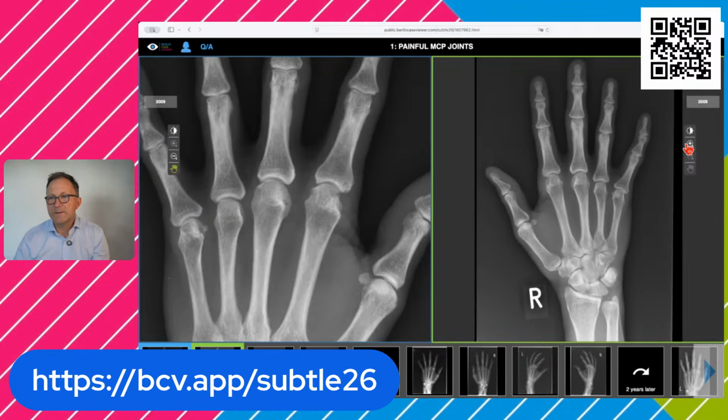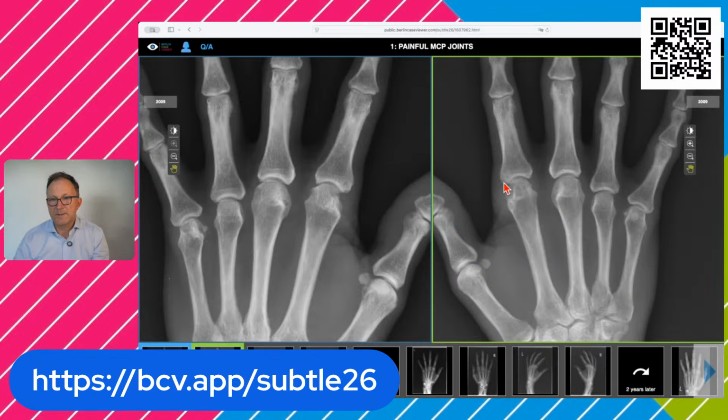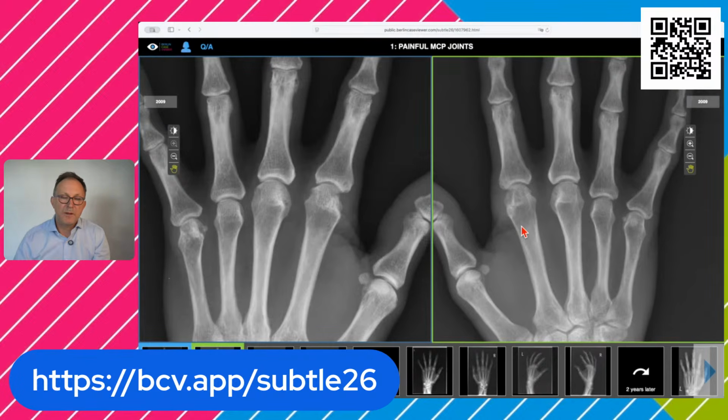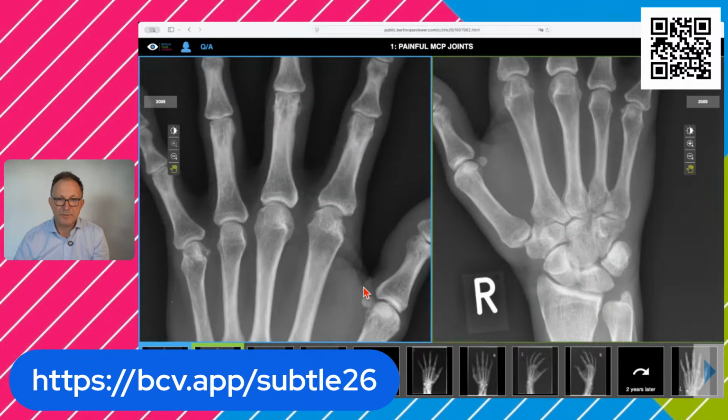And if you compare with the opposite side, that's not helping here, because you also see some smaller cystic changes. And here this looks quite good, but there's this density difference. So there is this low density area, and here it's higher density of the bone, and maybe there are some smaller cystic changes. So that would be in my report. I would say, yeah, that's a suspicion of an early erosion, and I cannot rule out more erosions here at the head of the metacarpals. The wrist itself looks good.